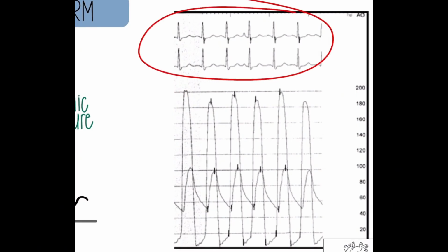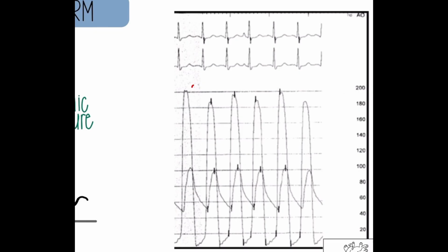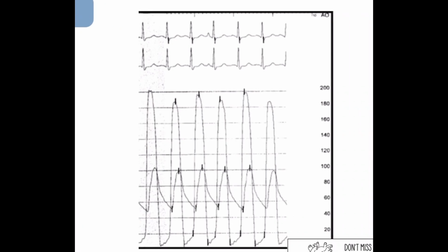We have our surface EKG, which is great because we need that. Now, there's not too much variance here. There's a little bit, but nothing really to write home about. So I just really want to choose one that doesn't have any of these markers on it. So let's just go with this one right here. So I would say LV systolic pressure. I'm going to bring that over to scale. This one is beginning diastolic pressure. How dare I put my logo in the way? But we know down here is 0. So I'm going to say that's 10. I'm going to say this is right on 180.